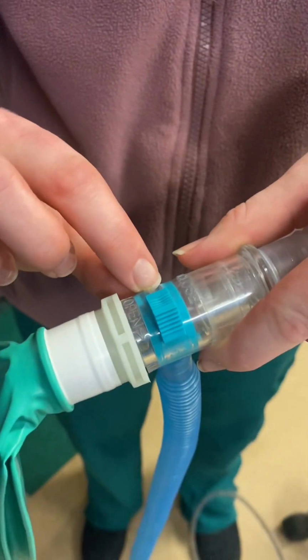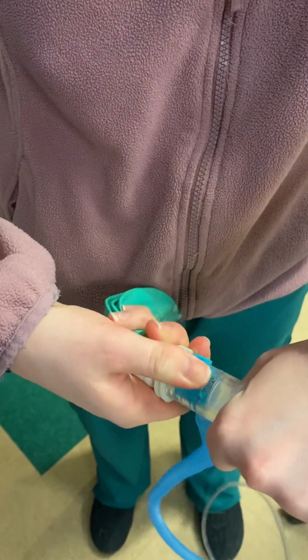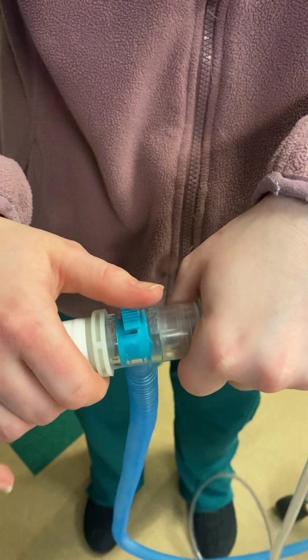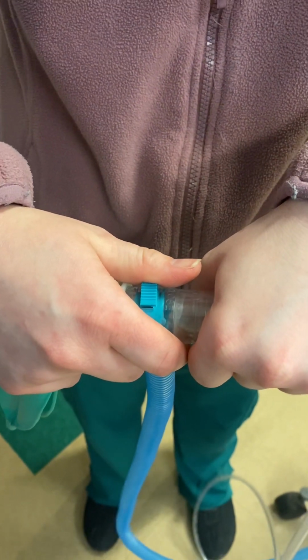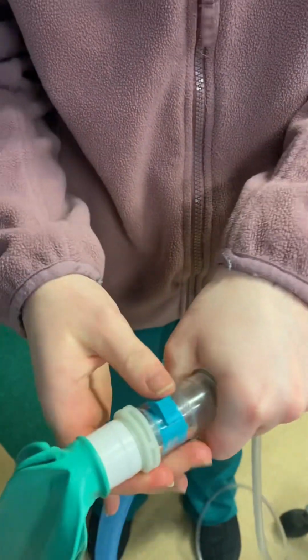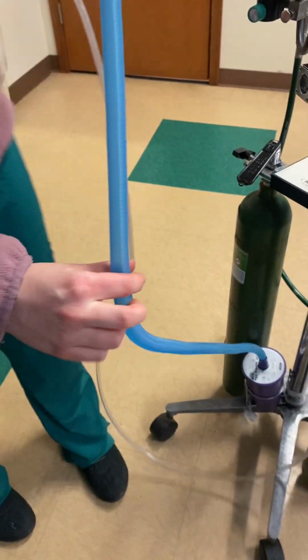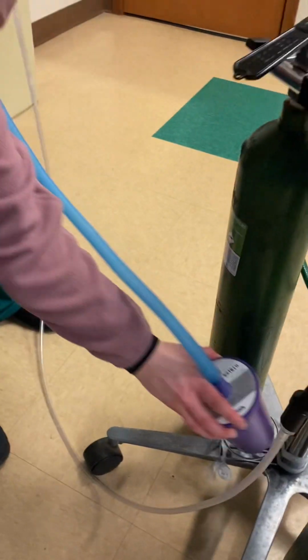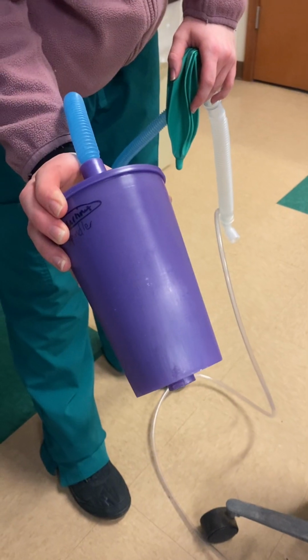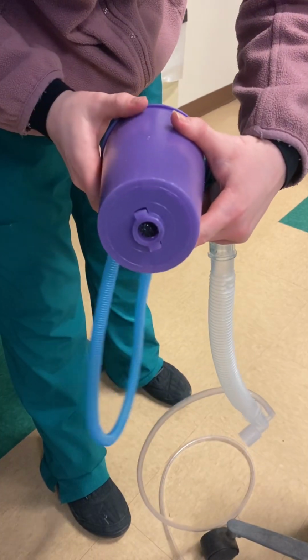This is the pop-off valve. The pop-off valve can be either opened or closed this way. The pop-off valve should never be closed when a patient is under anesthesia for a long time. This means the patient is not exhaling. So we open that up right away, and then it goes through the scavenge tubing, which goes straight into the scavenge. This is the scavenge. It absorbs excess CO2 and inhalant. It's made out of foam and activated charcoal, and oxygen is able to be released at the bottom.